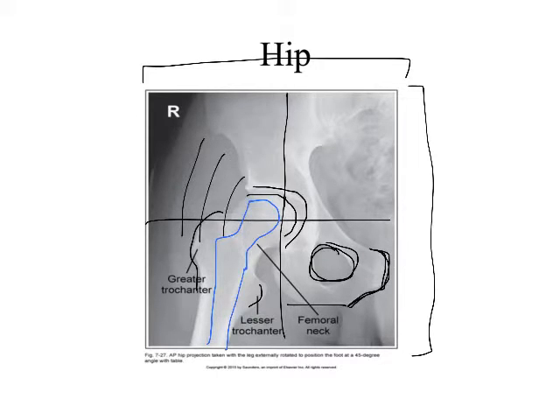If this was the image that we had, is this image now appropriately centered? No. I need to include all of any hardware on this image. That may mean shooting the entire femur, right? I've been in those cases where something went haywire in surgery and now they've got wire all over this thing, and you know that it's going to be at the end of the shaft. So you might as well just shoot a hip and then shoot a femur basically, right? But in this case, this image would no longer be centered appropriately just because of the hardware that's apparent in it, okay?